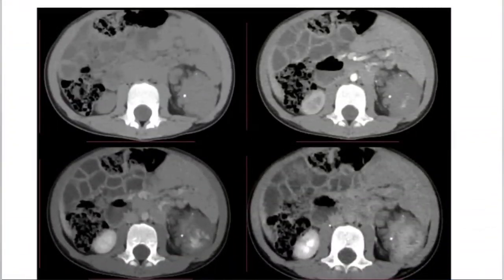Sir, these are CT abdomen images performed in plain, arterial, portovenous, and late phases, in which I would see that there is distorted morphology of the left kidney, which is showing a blush of contrast, progressing on the portovenous and the late phase images. I did not see this hyperdensity in this region on the plain phase or the unenhanced examination. Appearances are suggestive of active bleed.